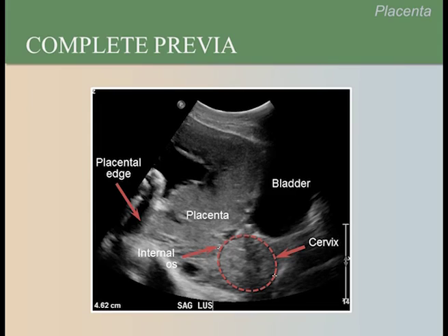Notice how the placenta completely covers the os. Here again, the calipers measure the entire length of the cervix. The upper caliper is at the internal os. Often the cervix is easier to see during scanning than on still images, as you will see in hands-on training.